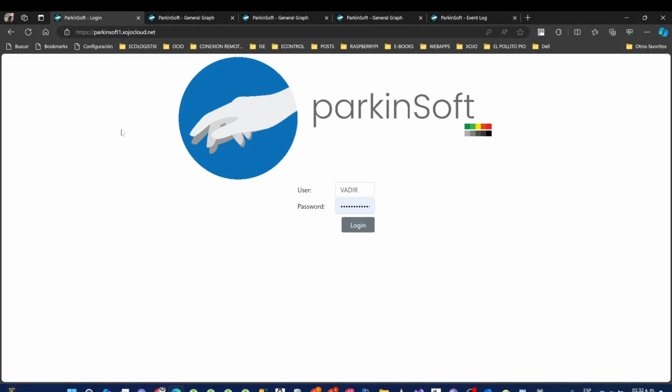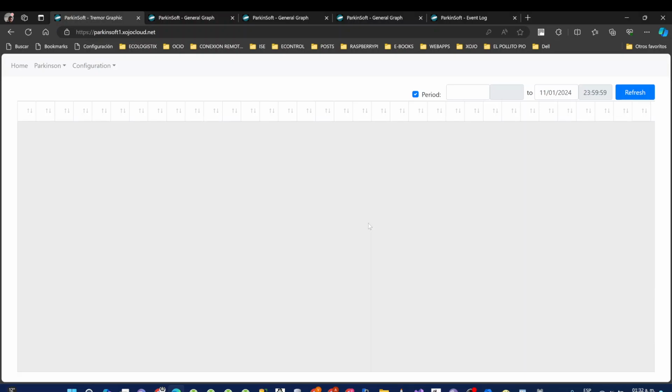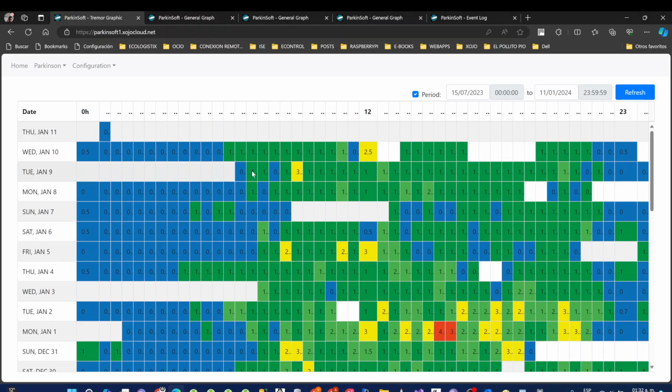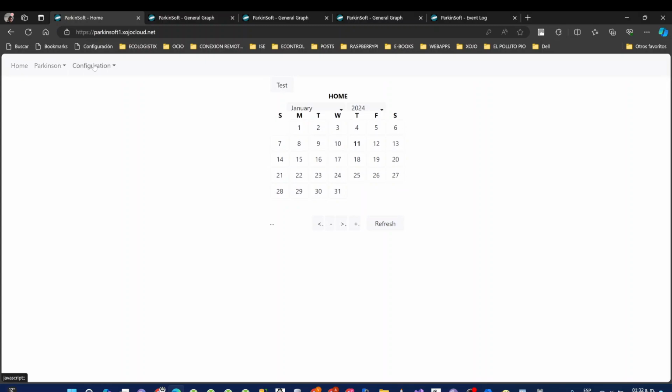Introduction. Hello everyone. The following video describes how to use the main modules of the web app for patients diagnosed with Parkinson's disease, parkinSoft. The basic modules to manage the parkinSoft web app are Catalogs, Graphics, Event Log, and Event Capturing. All of them accessible through the app's main menu, composed by three options: Home, Parkinson, and Configuration.